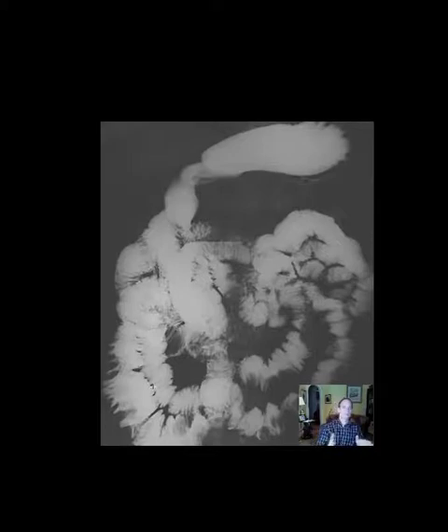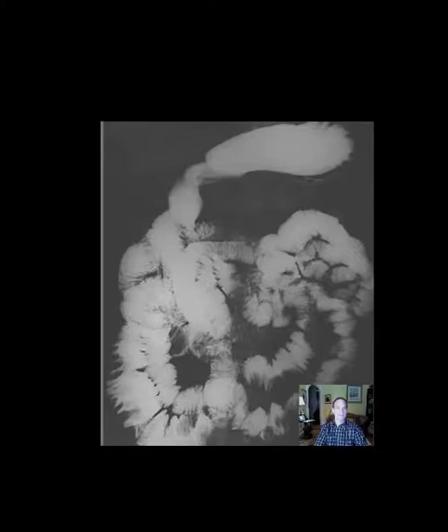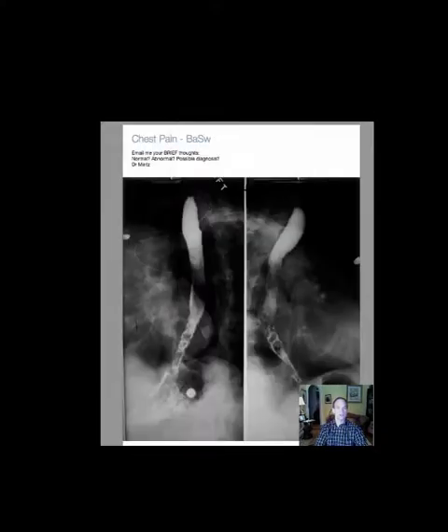Here again, we're getting farther than we need to, but suffice it to say that this is a case of small bowel follow-through showing multiple smoothly marginated filling defects in the small bowel, with relatively mild to moderate mucosal thickening in the small bowel on the right side of the abdomen. Could be adenomas, could be metastases. In this case, it happens to be lipomas. So focus on that aspect, meaning the descriptive terminology.